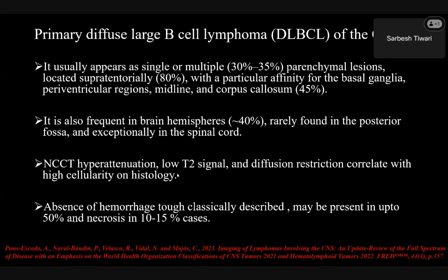We have discussed this hemorrhage. Somebody has written a differential: toxo, GBM, tumefactive MS, abscess, sarcoidosis. Excellent. Sarcoid, to have such a large lesion is a little difficult. Generally, you have granulomas, but you don't get such a large lesion. But okay, I take it. Abscess will not show homogeneous enhancement. Okay? It will be more of a necrotic lesion. So abscess to keep as a solid lesion is difficult.